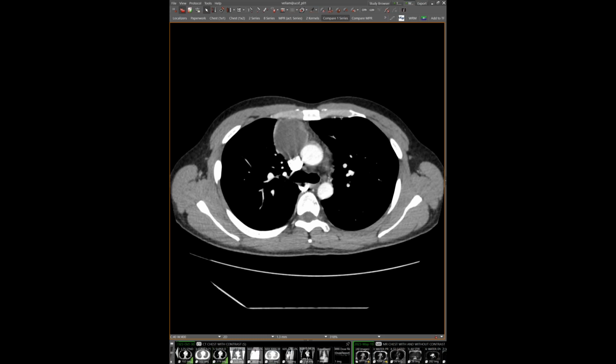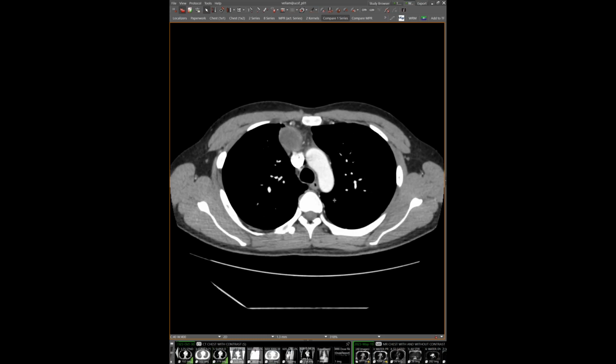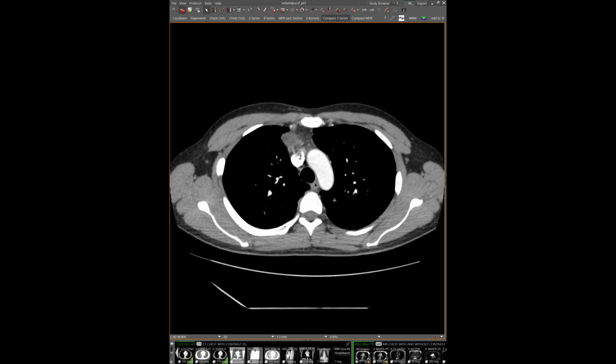Because this one on CT was mostly low density, we were like, well, maybe it could be a pure cyst. I think the MRI showed us that there were some enhancing components to it, which made them more convinced that they were going to take it out. But if this had not been low density on CT, this would have realistically just come out, unless we thought it was lymphoma. Makes sense. So what did the histology show? It showed sebaceous glands in the wall of it, which would be very unusual for any other thing arising in this area. Basically stuff that we should see normally on skin.